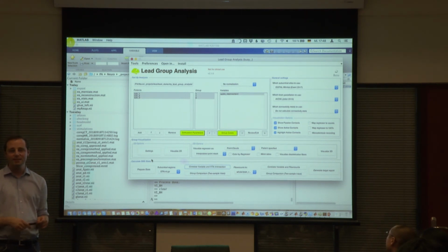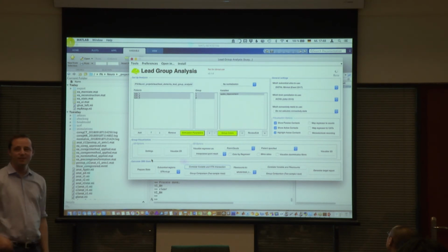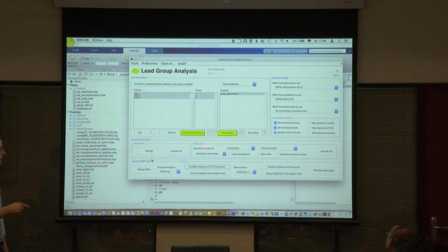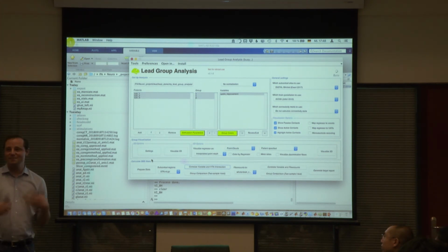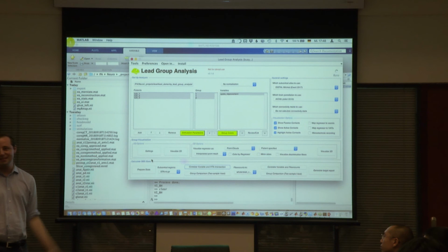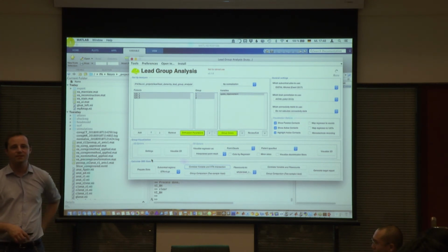Okay, so it depends a bit. Your analysis needs to make sense somehow. For example, if you have UPDRS improvement, you should also have active contacts here. So the stimulation parameters should be there. If not, it won't know where to map those UPDRS improvements. And yeah, as said, bear with it a bit. It's really a work in progress, and let us know if there are problems, and we'll try to help.